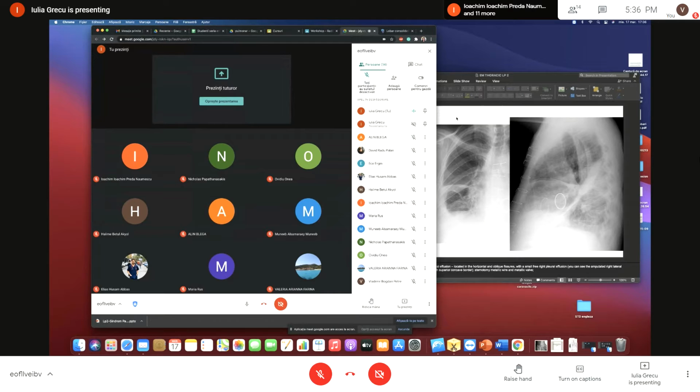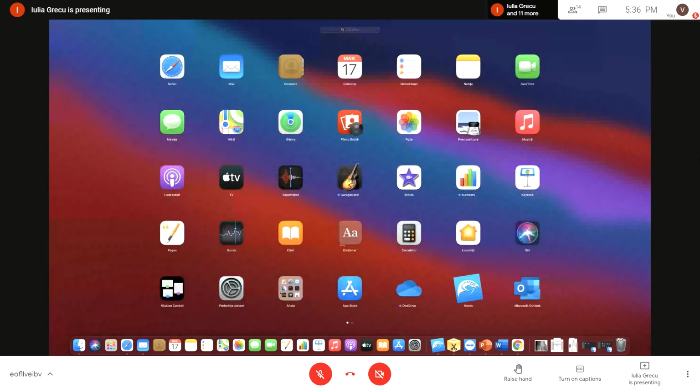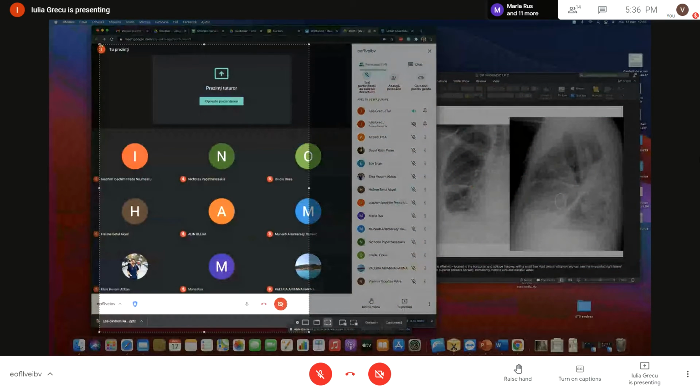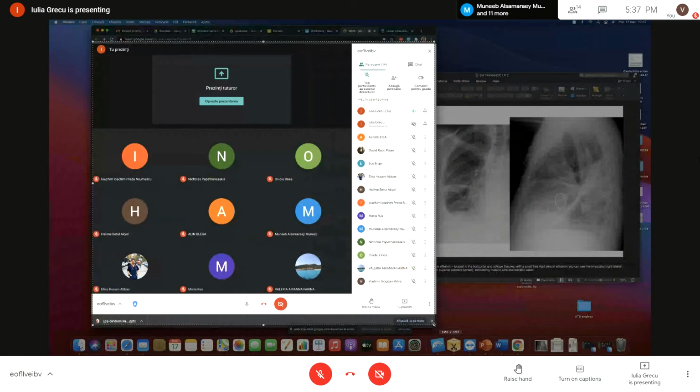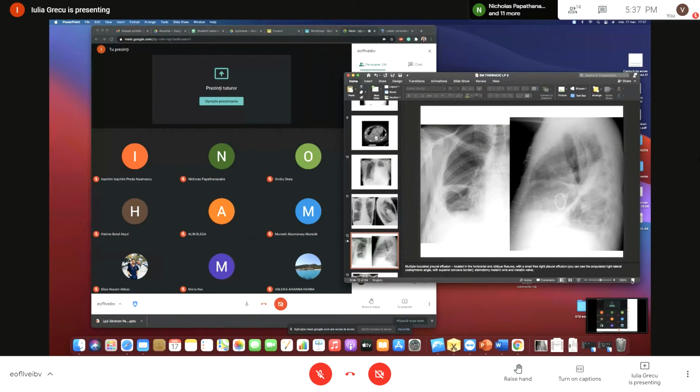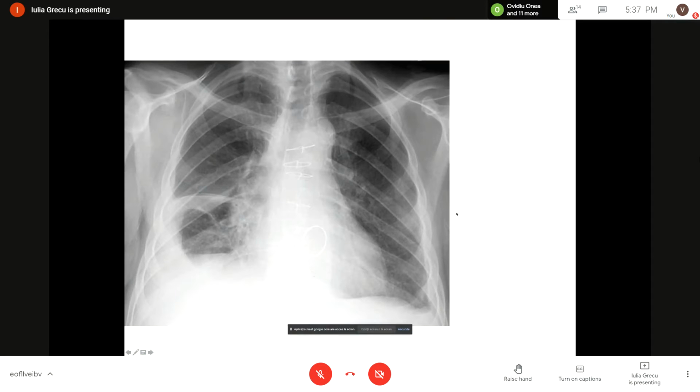Okay, so just give me a second so that I can make a screenshot with the presence. And in a moment, I will show you the film again. Okay, so this is it. Okay, Aline, so tell me, what can you say about this film?